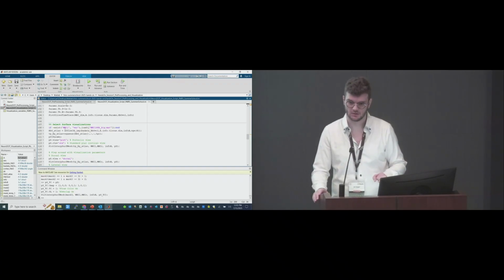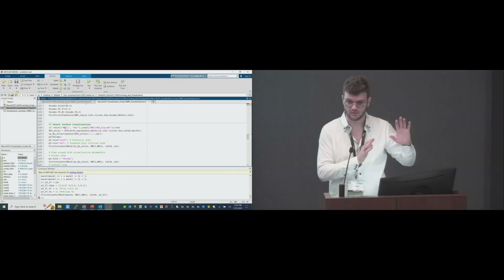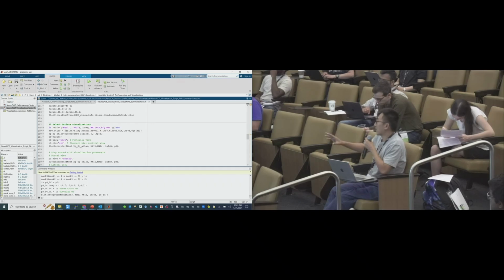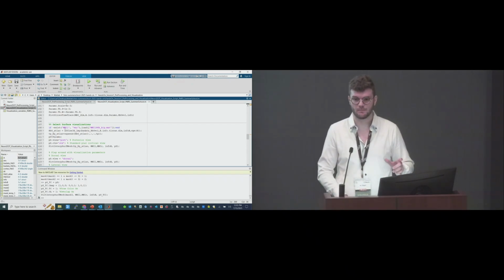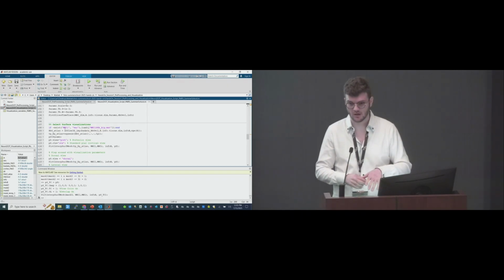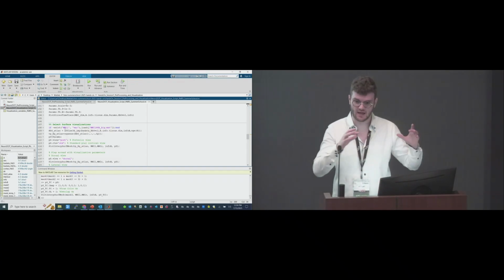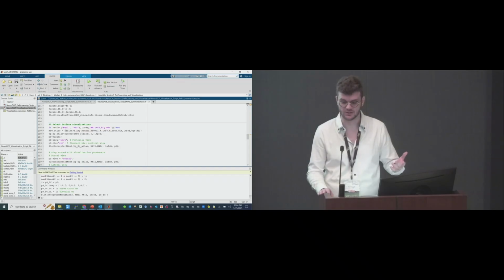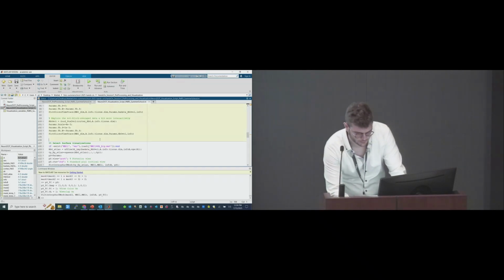Does that make sense? Because you're dealing with strictly anatomical information of the entire head from the T1 data. FreeSurfer can get that structure, but we also have the volume data from the fNIRS data. The volume data from the NIRS data is this: you take your NIRS data, you have the metadata for your FreeSurfer volume space, and you turn the NIRS data into a volume of the same dimensions and voxel sizes. That's what the function, let me find it again, Vox2Vol does in the toolbox.